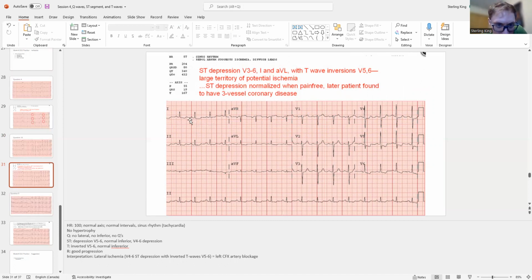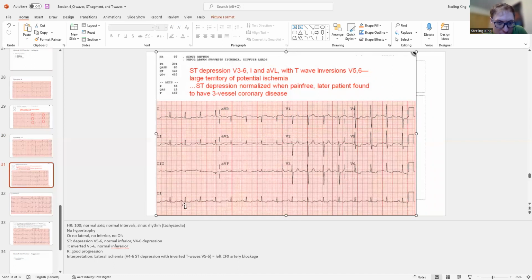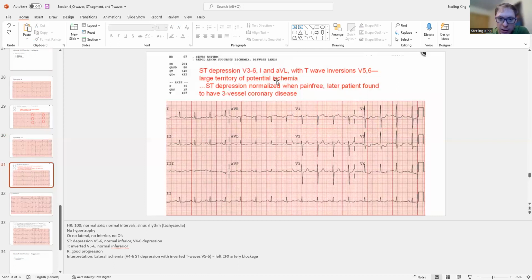This is like 1, 2 boxes maybe, and this is like 4. So yeah, I missed that. And then 2, 1, 2. AVL is pretty subtle. So 1, 2. I guess this is 1, 2. It's getting close to 3. Pretty subtle, but over here it's quite obvious. So in context, it makes sense. It'd be a little bit more scrutiny.